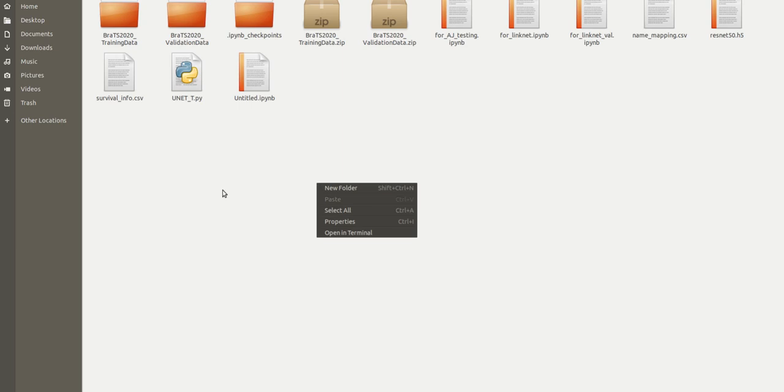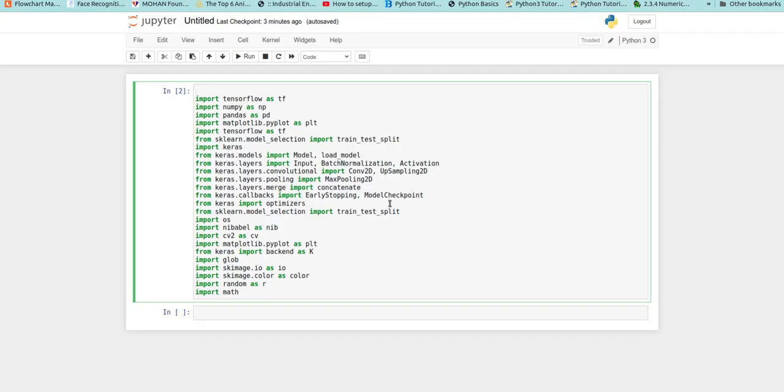model for 3D brain tumor segmentation and classification. So let's move forward, and I will use the segmentation models of TensorFlow, and simultaneously the Linknet. So here I'm importing the basic libraries of TensorFlow. This is a lengthy tutorial, so keep watching so that you will be capable of doing the implementation in the future. Okay, let me add the title first.